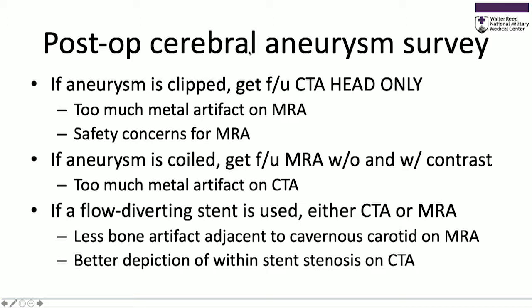Well, what do you do after an aneurysm has been treated? The one I just showed you, the aneurysm was clipped. In those, I strongly recommend you go to CT. The metal artifact on MR, even with the new MR compatible clips, can still be problematic. There are still some safety concerns at 3T. Conversely, if the aneurysm is treated endovascularly with coils, those coil masses are so dense you get very bad streak artifact on CT, and I recommend you go straight to MR angiography.